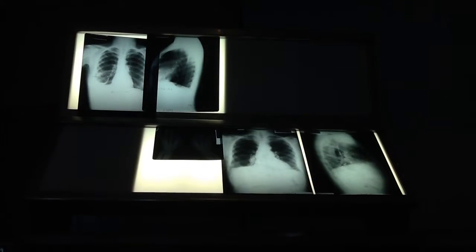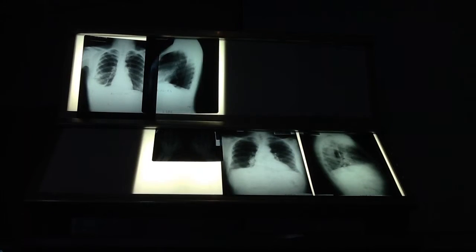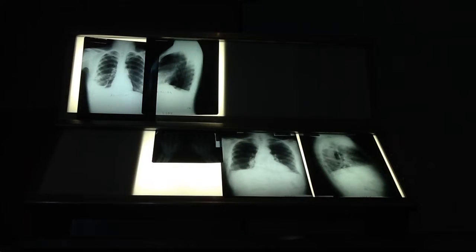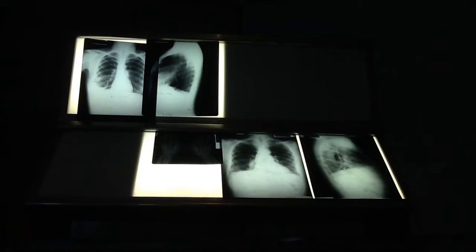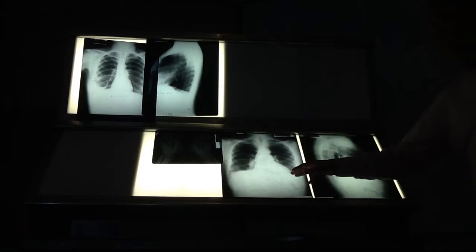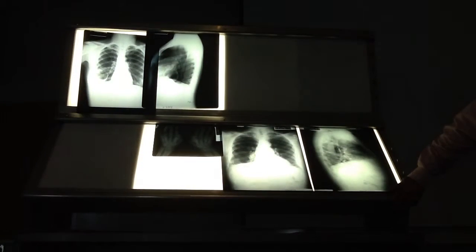And rheumatoid classically has things go in and out of the lung fields. Those range from pleural effusions that come and go, to nodules that come and go, to cavitations that come and go, to the fibrotic disease, which usually stays. Okay? Once you're getting that scarring, the scarring stays. The scarring is all a reflection of chronic inflammation. Okay? I must tell you that when you start seeing things like this, really the last thing you think about is things like rheumatoid arthritis.